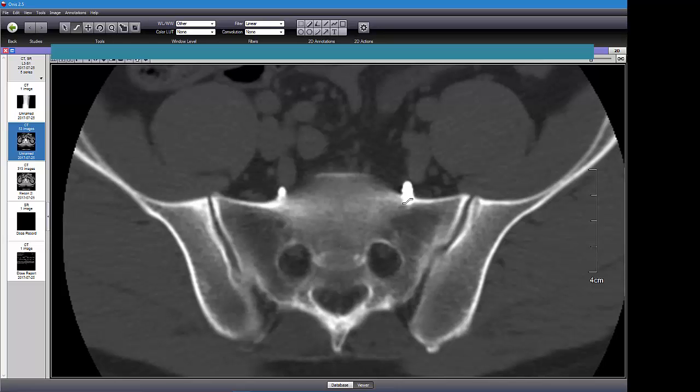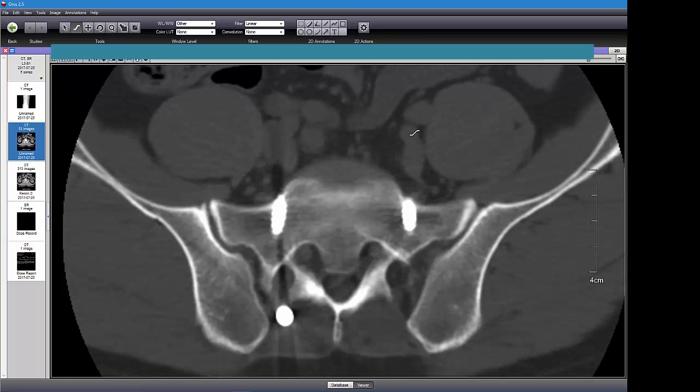Oh, look what we see here. There's the trademark of our surgeon. He likes to extend screws into places they shouldn't be. So this screw is extending very close to this vessel too. You can see the blood vessels, right? Look at all the different blood vessels here. So it's a whole bunch of iliac arteries and veins, and they have branches off them. So, boy, I sure don't like that.